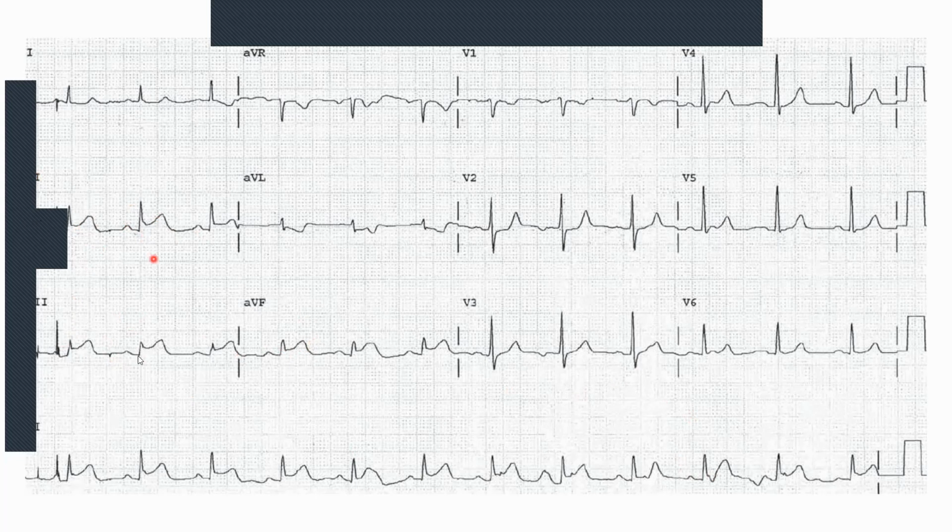The one thing that I always do whenever I've got a patient who's got elevations in leads 2 and 3 is compare the two. So here we've got 1, 2, we can say 3 blocks between the neutral and the ST elevation. And if we go to lead 3, we've got about 1, 2, 3, just about 4 blocks, so slightly higher. So it's a rule of thumb that whenever lead 3 is higher than lead 2, the ST elevation that is, we can say that we've got a right-sided extension as well.